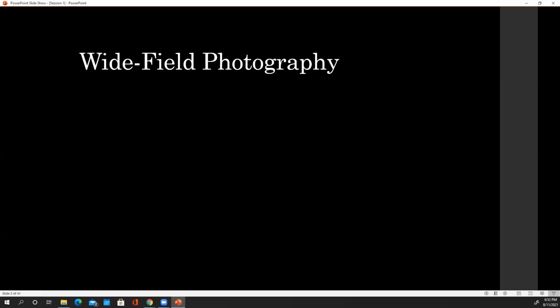So let's go through wide field photography first. The one is Optos, because it's the one that we have. They call it ultra wide field because it means it's 150 degrees of viewing, or anything greater than 150 degrees. So what is 150 degrees? Well, 180 degrees would mean that I could see to my left and my right, the whole half sphere in front of me. So 150 degrees approximates that, but still leaves 15 degrees on either side, a wedge that you wouldn't be able to see.